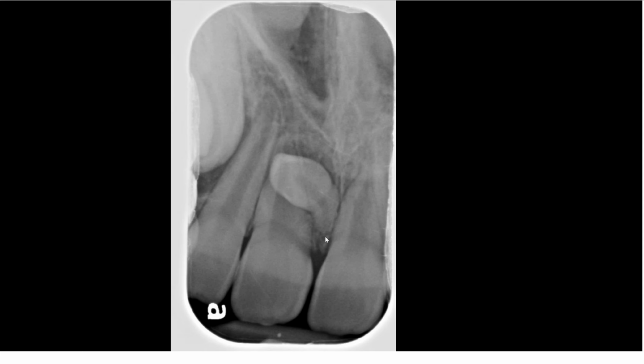And importantly, we have somewhat of a horizontal but also inverted mesiodens. It's certainly dilacerated such that the roots are located between the roots of the central incisors, and then it's somewhat inverted, then it becomes horizontal as a part of this dilaceration.